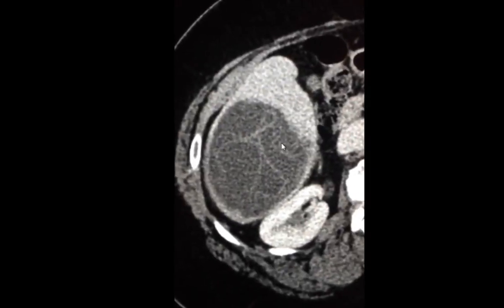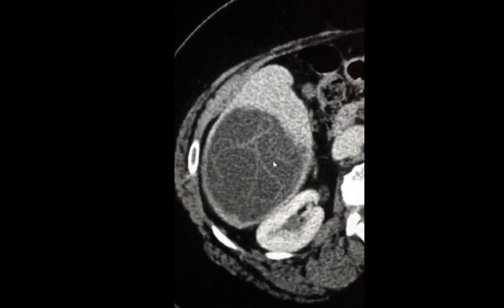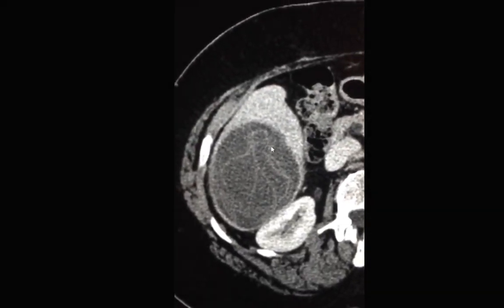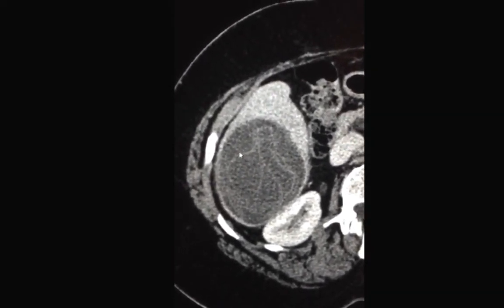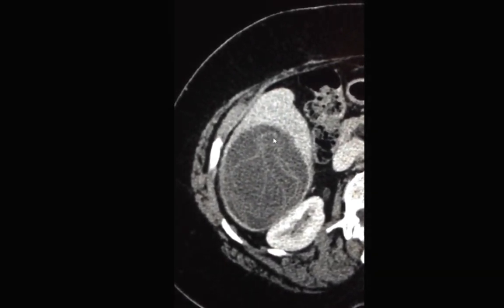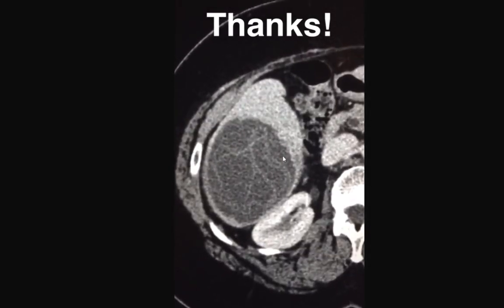The appearance is characteristic of hepatic hydatid disease. Since there are internal hydatid membranes, when they separate, they may float within the hydatid fluid. Sometimes this membrane is not clear on CT scan and is better appreciated on an MRI. This was a quick classic case. More cases later. Thanks.